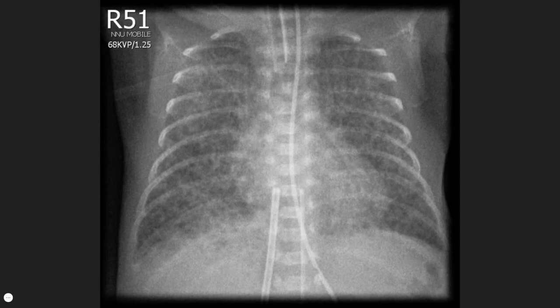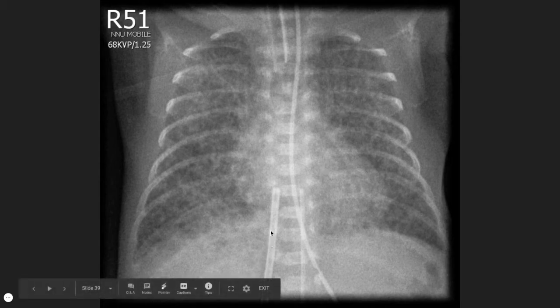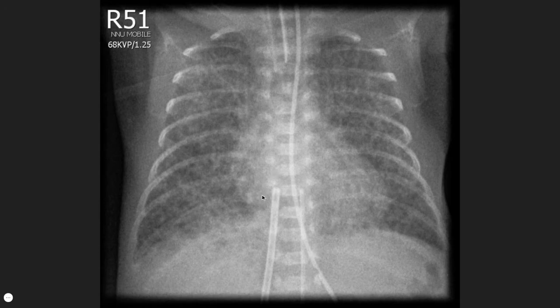This is the chest x-ray of an 8-day-old preterm intubated neonate and shows bubbly lucencies in addition to granular opacification with hyperinflation. These appearances are in keeping with pulmonary interstitial emphysema, also known as complicated RDS. Pulmonary interstitial emphysema represents air in the pulmonary interstitium and lymphatics secondary to barotrauma in patients with RDS on positive pressure ventilation. Also note that there is a malpositioned UVC with its tip projected over the right atrium, which will require withdrawal before use.